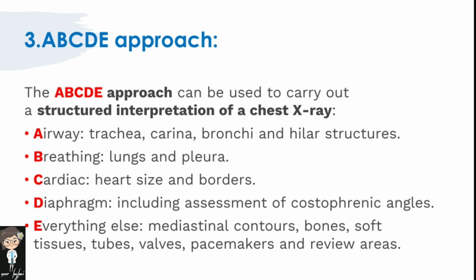further subdivisions. Third and last checkpoint of airway is hilar structures. Hilar consist of main pulmonary vasculature and major bronchi. Each hilum also has a collection of lymph nodes which is not usually visible in healthy individuals. Hilar are usually of the same size, so any asymmetry should raise suspicion of pathology. Hilar enlargement is caused by sarcoidosis and underlying malignancies.